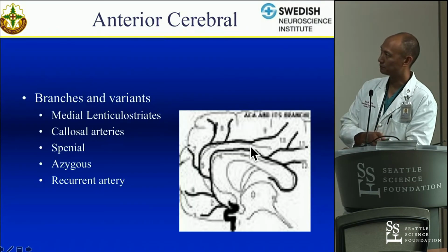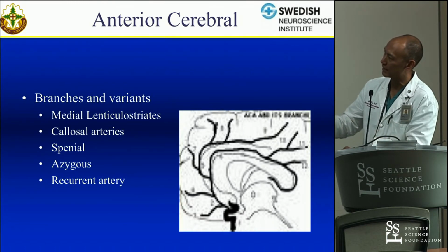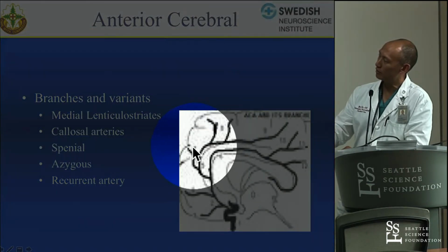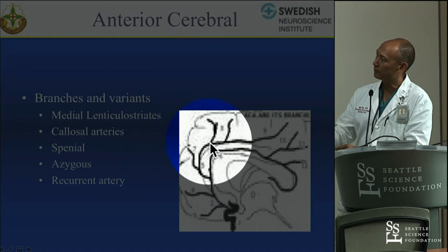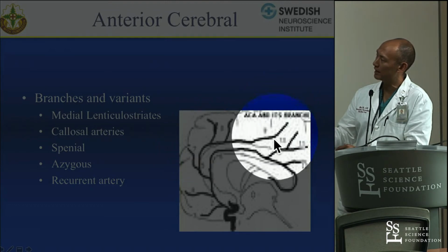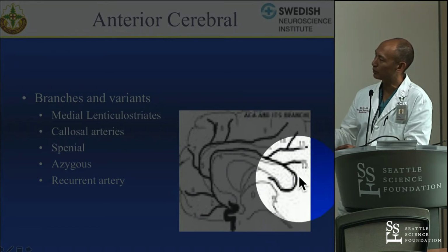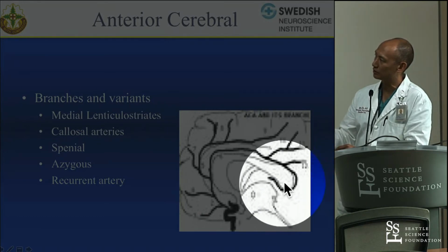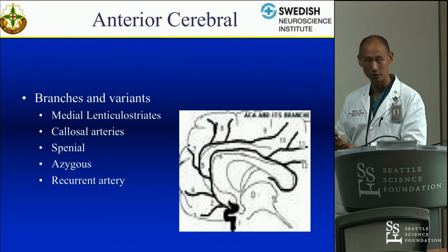The A3 segments then can break down into the medial frontal branches, which are also called the medial frontal candelabra, and those medial branches are typically a trifurcation, so an anterior, a medial and a posterior, and then a callosal marginal, which typically will end in the precuneus. The pericallosal artery will wrap around the callosum and help supply the posterior splenial artery, which is the collateral zone, collateralizing with the posterior splenial artery of the posterior cerebral artery.